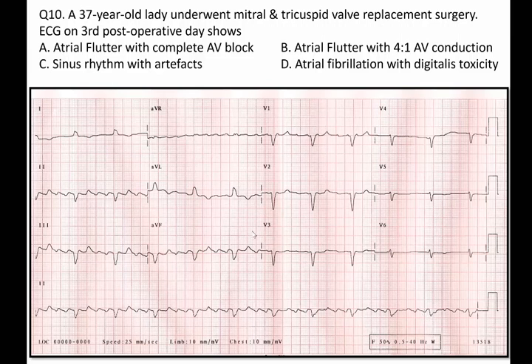And if there were intact AV conduction with regular RR intervals during atrial flutter, one should have PR intervals which are constant in all the QRS complexes. Now let's look at the PR interval in the first beat here. You find that the PR is quite long, and let's look at the PR interval in the last beat in the rhythm strip. The PR is quite short.